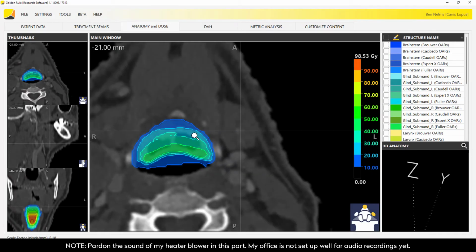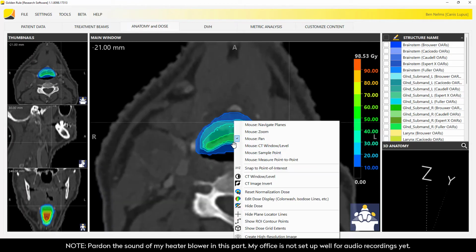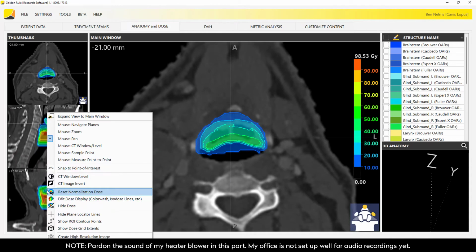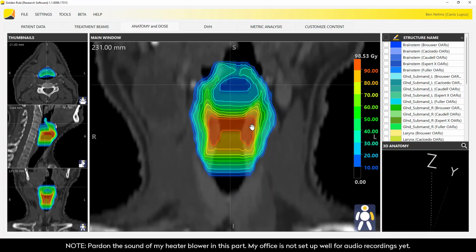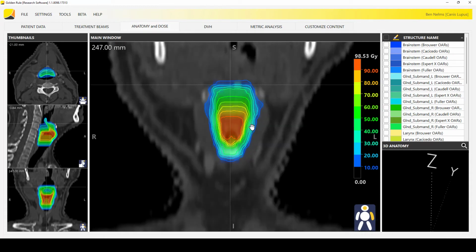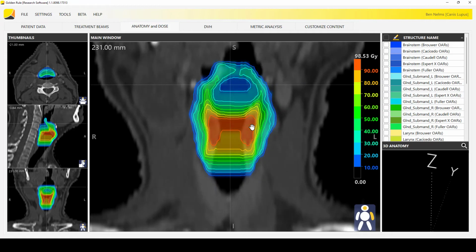Let's zoom out and try to figure out what's going on here. Pan around. Kind of get into the middle. All right. So clearly you can see, let me put the coronal. This is what a highly variable set of opinions look like. Very little red and orange and a lot of everything else.